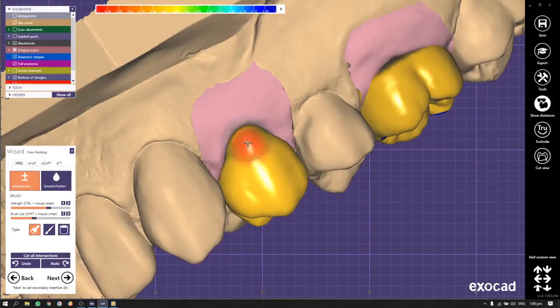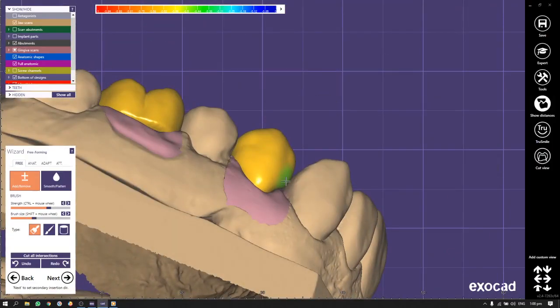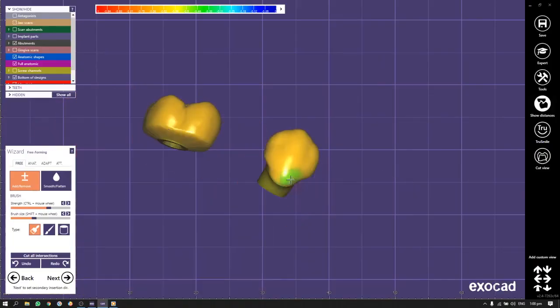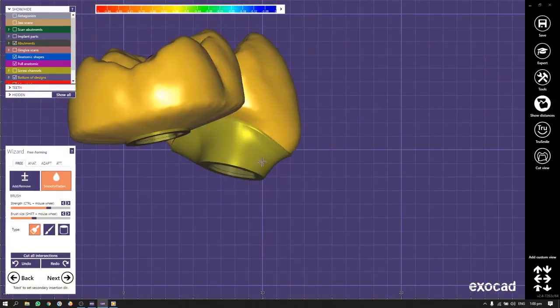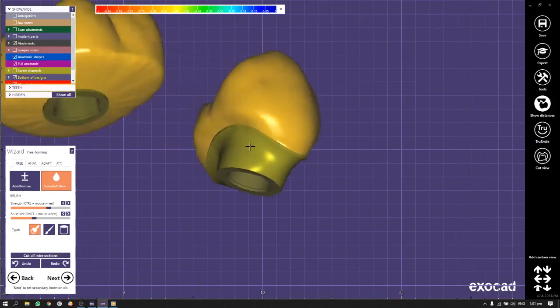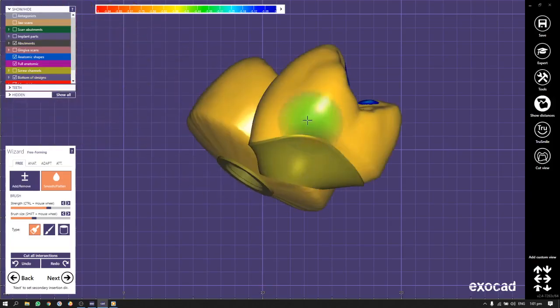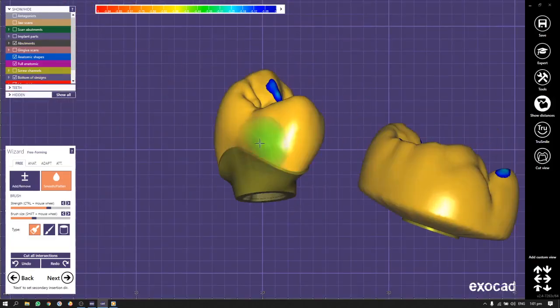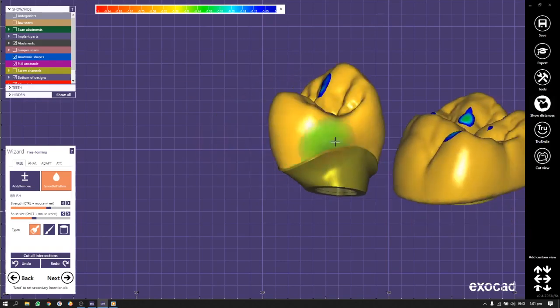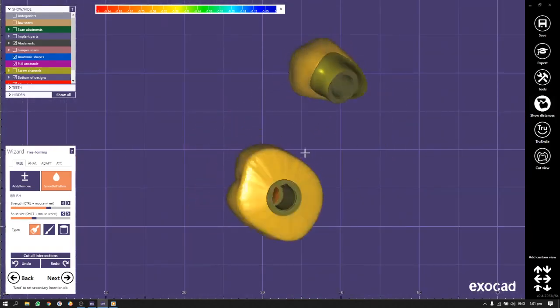But right now I want to show you the trick of this line that we placed for abutment, and we didn't draw it for the screw retain crown. We have this form of the chalice, some gingival part, which is not movable. No matter how I try to design it, it's not reacting. And this transition edge, transition line, we have to smooth it. So we have full anatomy, we'll have this edging, and we have to try to smoothen it after the milling. That's why I didn't put points.